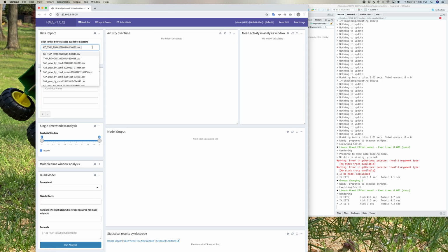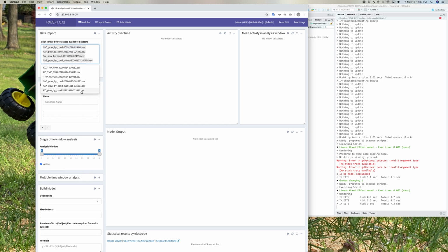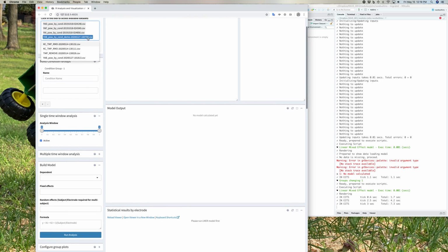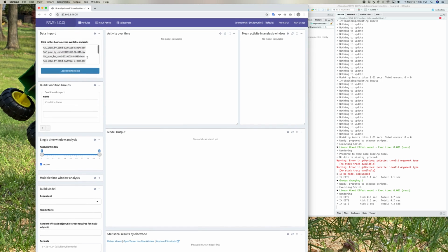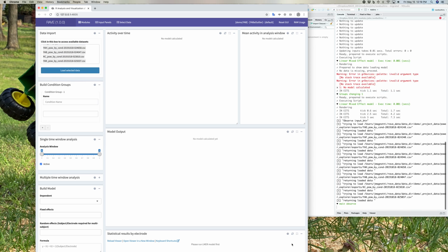Go back, load up a bunch of data, remove the 2020s. These are a lot smaller than the other data files, so they'll load quickly, but if you look in the bottom right, you do see the file that's being loaded. We'll trim that so that it only shows the name rather than the full path.